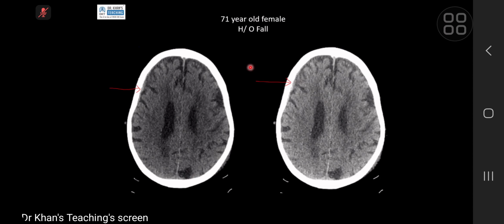This is a case of subfalcine as well as transtentorial herniation, sort of an exam case. When an examiner shows you this, they will see your description and your concepts. In subfalcine herniation, there is midline shift under the falx. So the ipsilateral ventricle, on the side of the mass, will be compressed and the contralateral will be dilated, particularly the occipital horn. This is so because the foramen of Monro, which is somewhere here, is compressed.